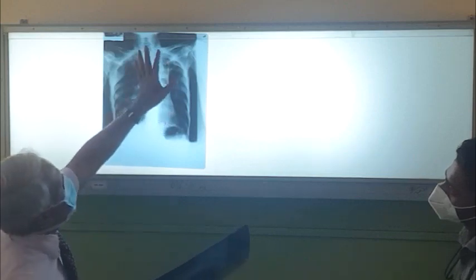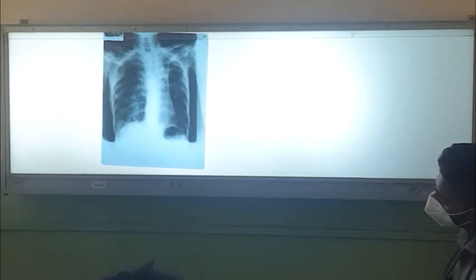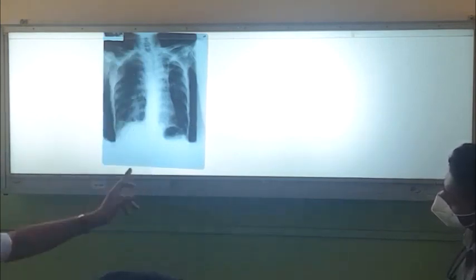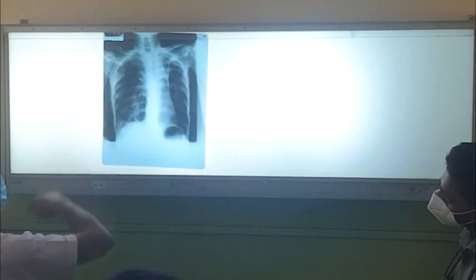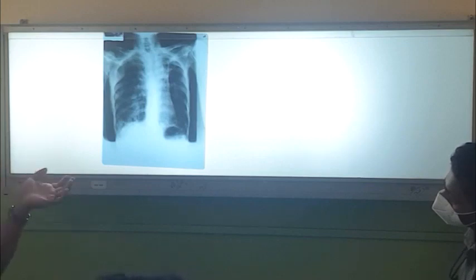Vessels gone down. That is because of the TB, with some fibrosis in the left upper division. And then on the right side you have some inflammatory shadows, and you can see the whole spine. So this is an overexposed film also, right? And in this area some pneumonic changes are there. And in addition to that, there is some other change. Can you all detect this?